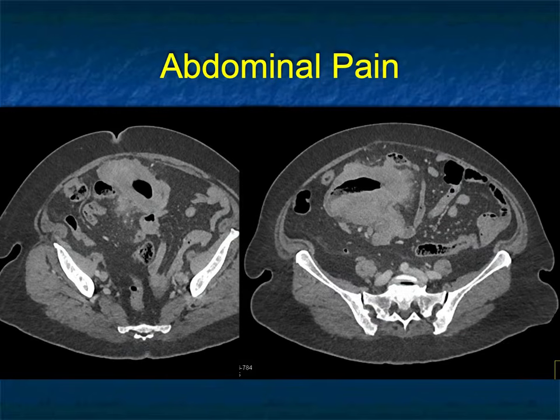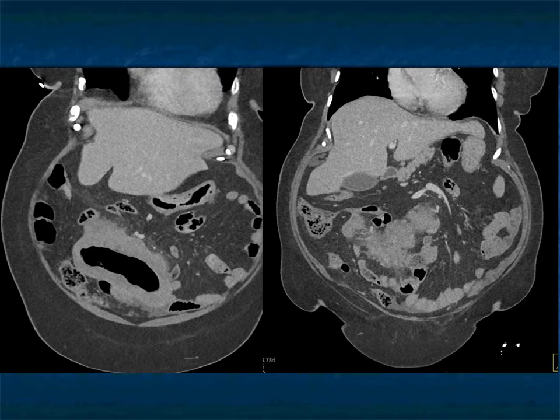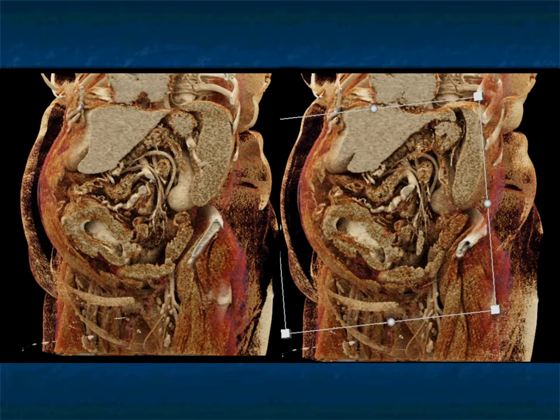Oh, abdominal pain, large mass, right lower quadrant. That's small bowel. Interestingly, the mass is ulcerating, but it's not obstructing the bowel. So you could think about tumors, right? You could think about adenocarcinoma. Usually it's not so bulky, just is not diffuse like that. This is more like lymphoma. You also could think about metastasis. There are nodes in the mesentery. Metastatic melanoma, metastatic breast cancer would be possibilities.